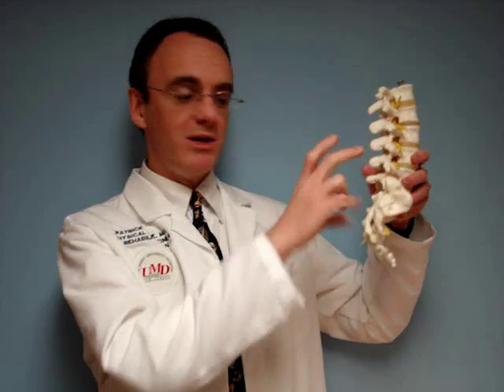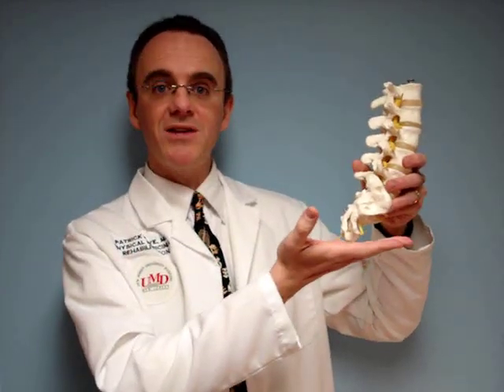Also, be ready to be shocked, because it is very, very common that when you and your doctor go to look at the x-rays and you've been told that everything's normal, it may very well be the case that the x-rays did not include the coccyx in the first place. The lumbar spine images will include up here. Lumbosacral spine will include part way or most of the sacrum, but they won't include the coccyx. Or just part of the coccyx may come in on the edge of the image.